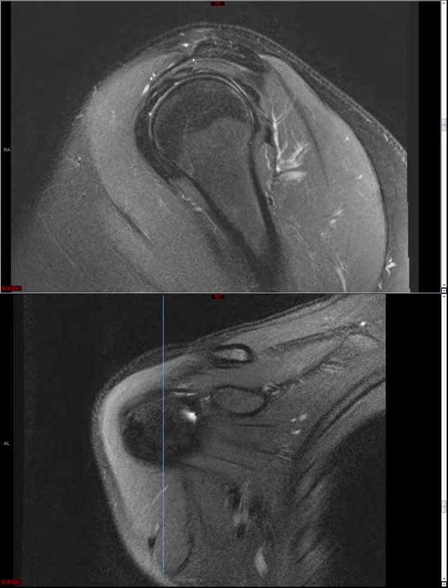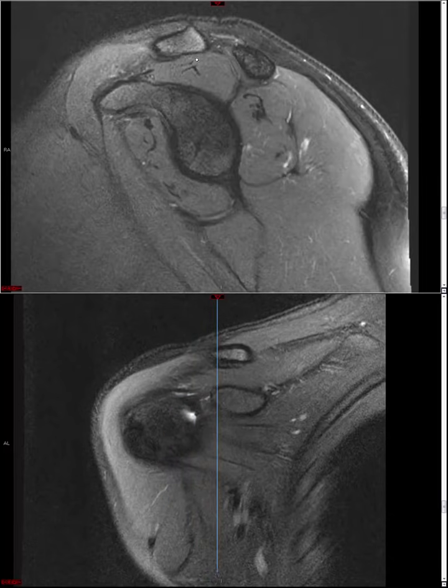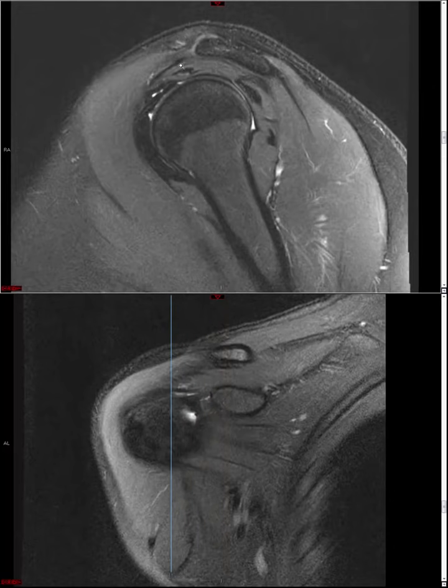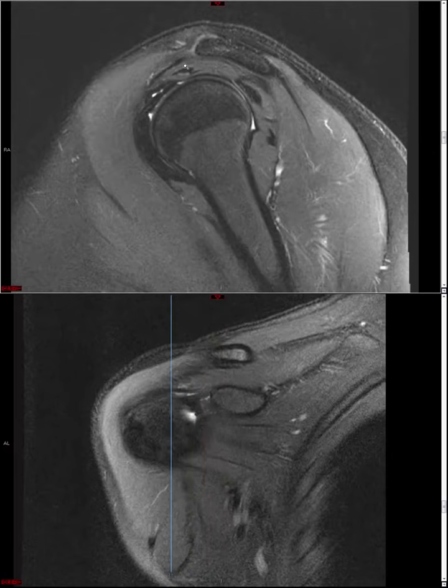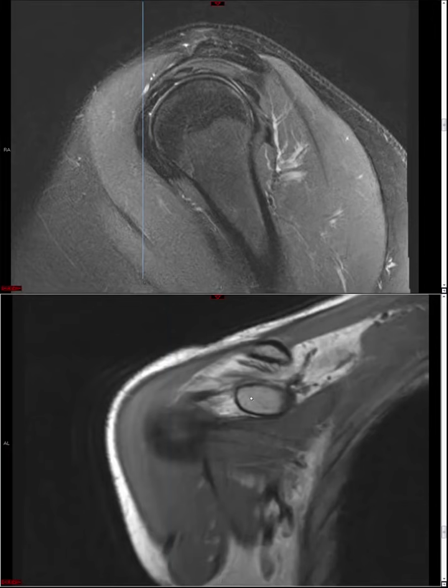And how do we find a subacromial enthesophyte? What I like to do is start at the coracoid, and you have a thin ligament called the coracoacromial ligament that's going to run from the coracoid to the acromion. And once I find that, so here's the ligament, you can see this little black structure here. Once I find that ligament attaching to the acromion, I ask myself, right here, is there an osseous excrescence? If the answer is yes, they have a subacromial enthesophyte, and if the answer is no, then they don't.